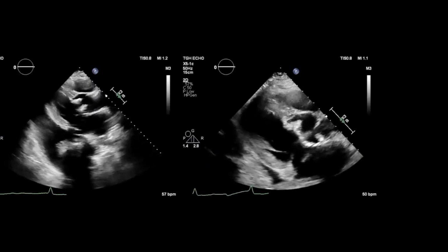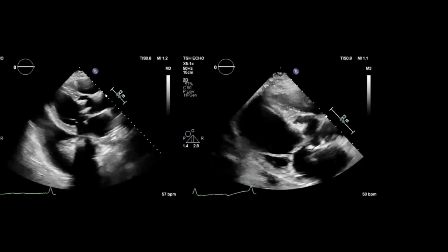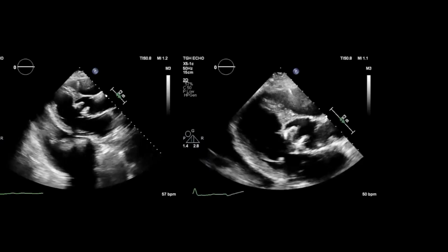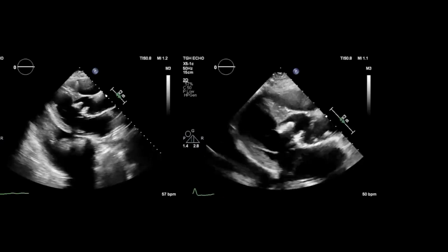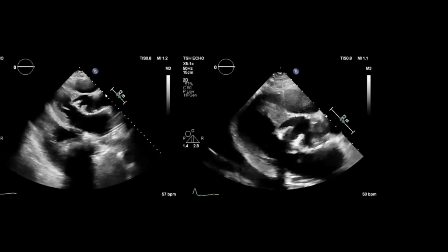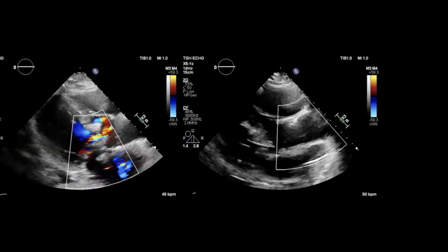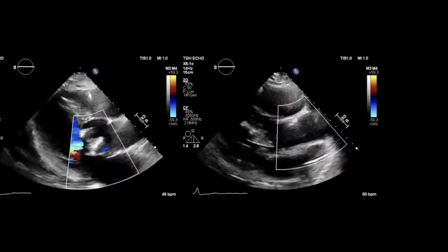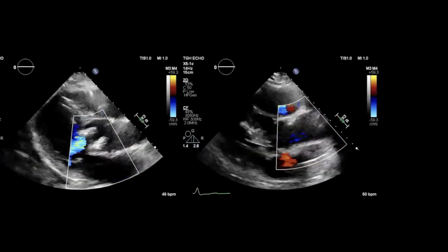Here's his echo images here. That's so odd. Yeah. And these are all cases I had last week. This is on the ward. These are all ward cases last week. Wow. It shows you the acuity and the variety of the. Yeah, so this is all within 5 days. Yeah, so it wasn't hard to pick these cases. Oh boy.